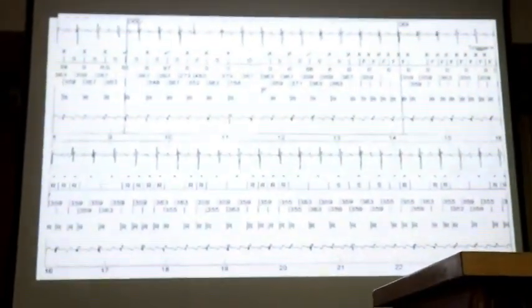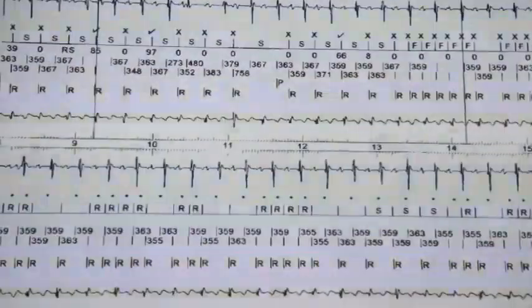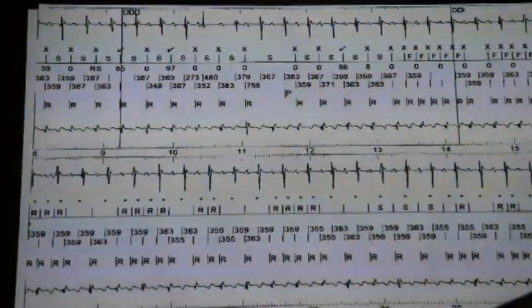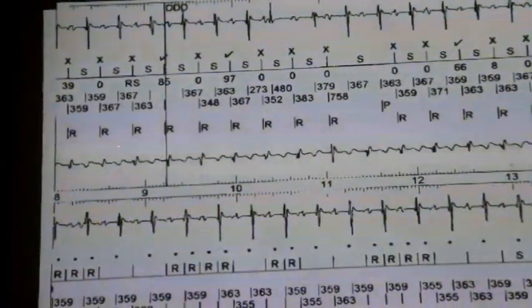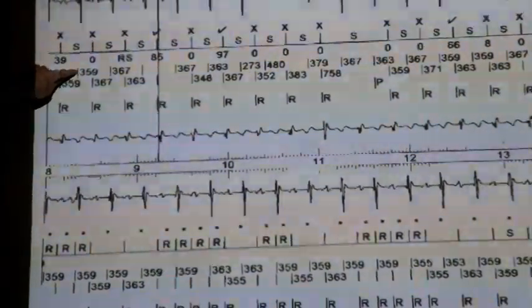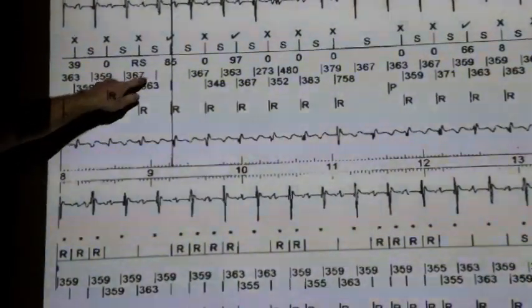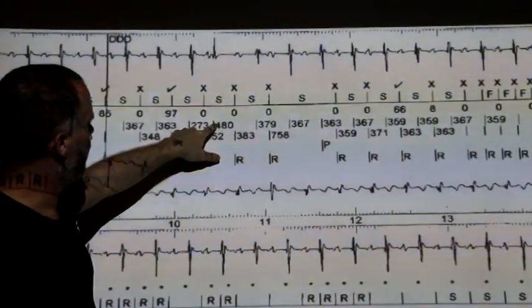So let's have a look at his episode. It's just like loads of markers, right? It's like it's too much, but work through it, it's okay. Atrial channel, ventricular channel, and then these are the markers, these things here. So this is the A marker on this device, V marker, A, V, A, V, A, V, A, V, A, V. Early A.